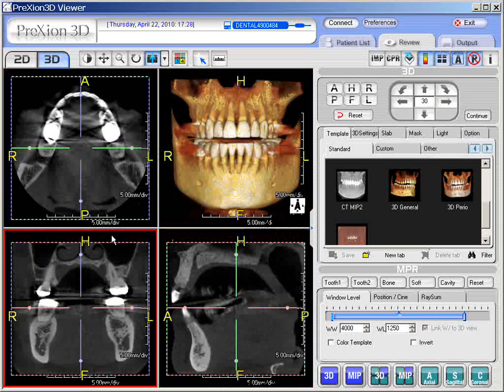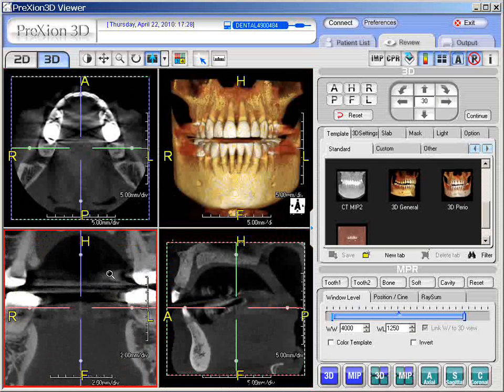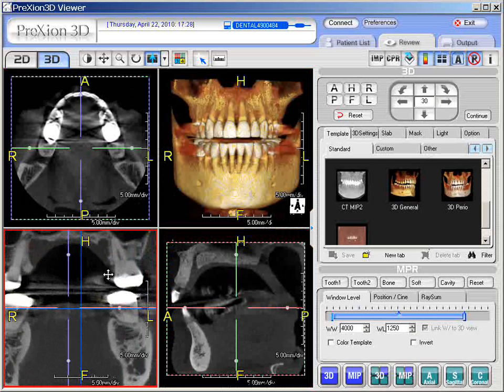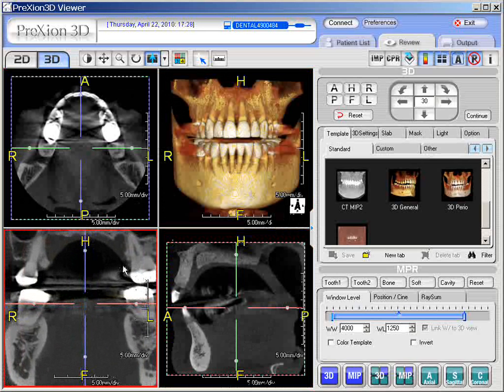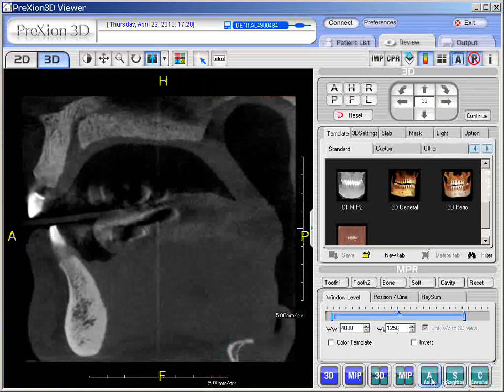If you want to resize it, again, one can simply press down the middle wheel and resize your image using the zoom magnifier. The pan is the same, right click and you can recenter. Remember, your reset button takes you back to the original position. Or you have your icons that can load up the particular screen that you wish, as we had seen in another section.